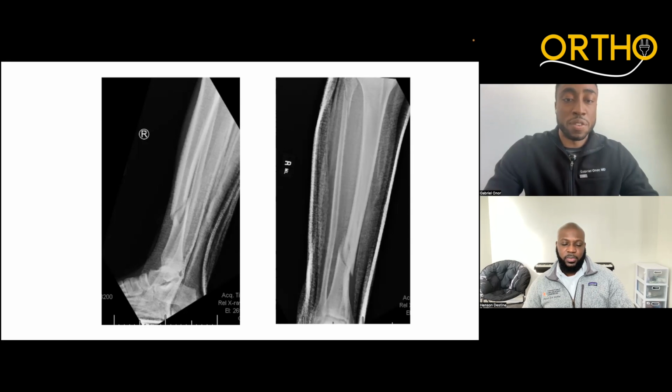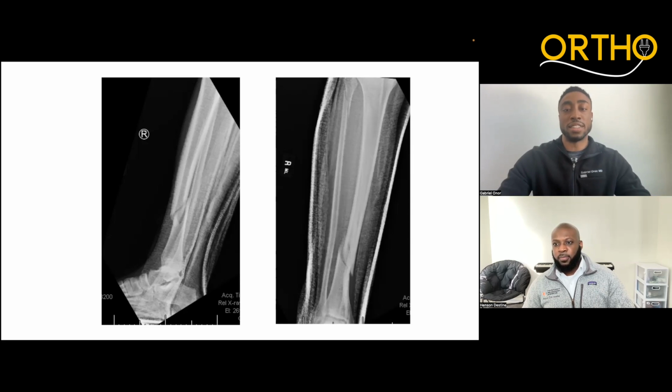And then one important feature of distal third tibial shaft fractures, you'll see it on ortho bullets a lot, and this is frequently a PIMP question, is the fact that they're very often associated with posterior malleolus fractures. And it's often subtle, and you can't necessarily always see it on x-ray of the ankle, because most of the time they're very non-displaced. They can be subclinical or so small that we wouldn't necessarily do anything about the posterior malleolus fracture, but very classically, distal third tibial shaft fractures are associated with posterior malleolus fractures.